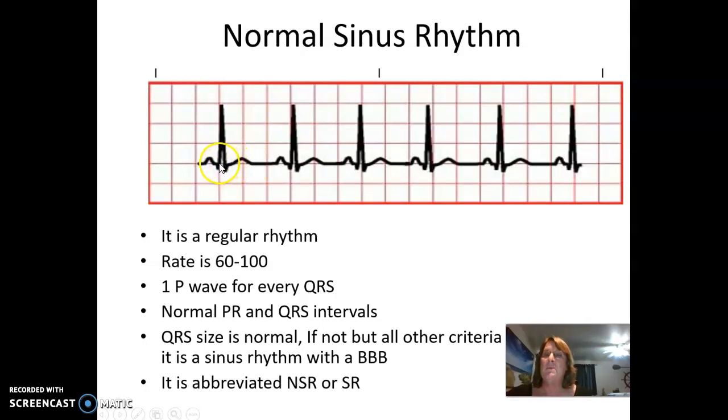And remember, this is telling me how long it's taking the ventricles to depolarize and repolarize, so it can do it again. And we said that the downslope of the T wave is our relative refractory time. That's our dangerous period, where a strong impulse landing on this downslope of the T wave can cause electrical chaos.